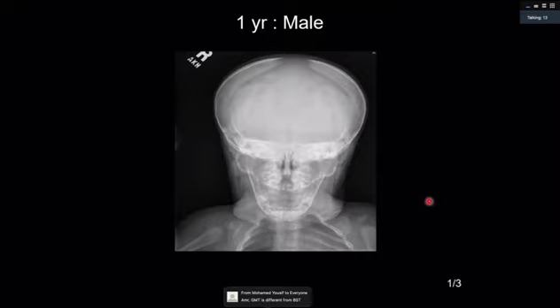Okay, this is a frontal plane radiograph of the skull of a 1-year-old male, showing increased bone density of both. Yeah, don't worry about bone density. That is right. Please continue. I think there's thickening of the skull bones, or is it projectional?